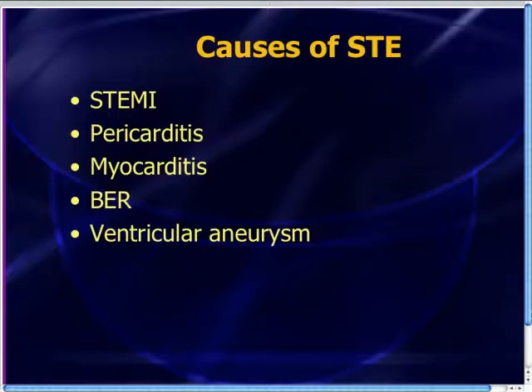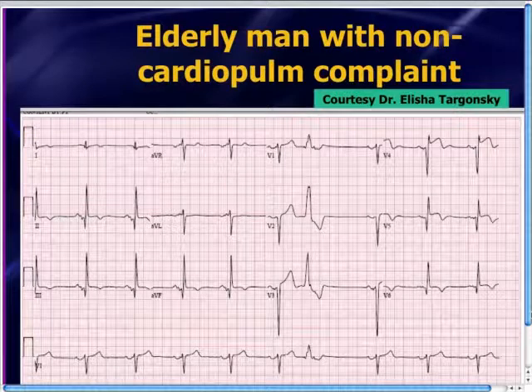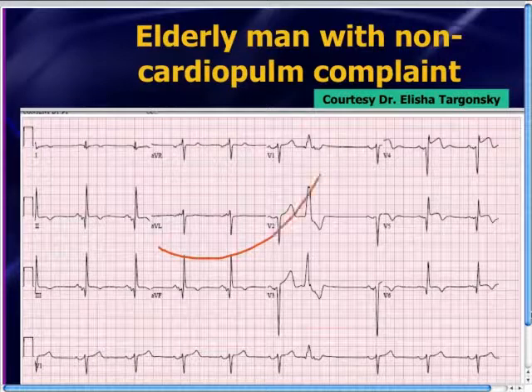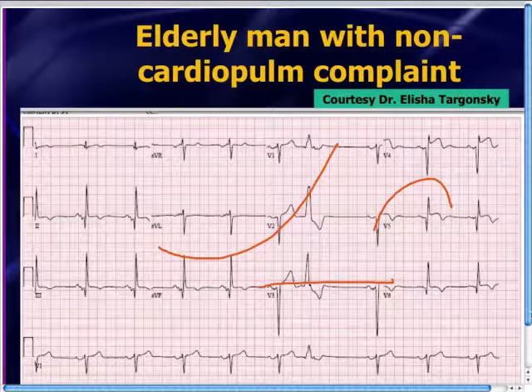Next, let's talk about some of these. Is there evidence of pericarditis, myocarditis, or benign early repolarization? Well, taking a look at that 12-lead EKG once again. Remember what we've talked about before. With pericarditis and benign early repol, the ST segment elevation should be diffuse and should always be concave upwards. If you ever have horizontal or tombstone type of ST segment elevation, you just ruled out pericarditis and early repolarization.